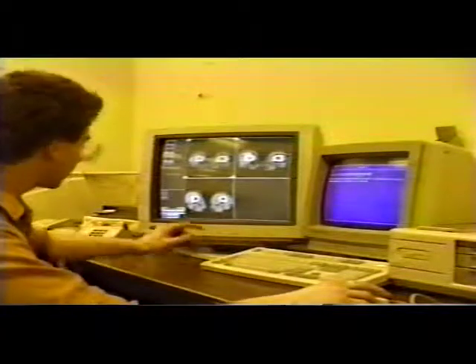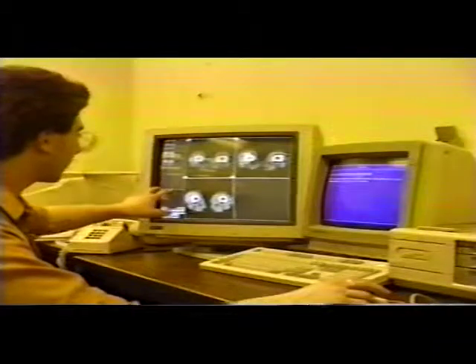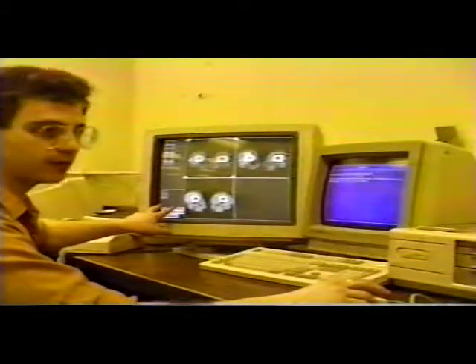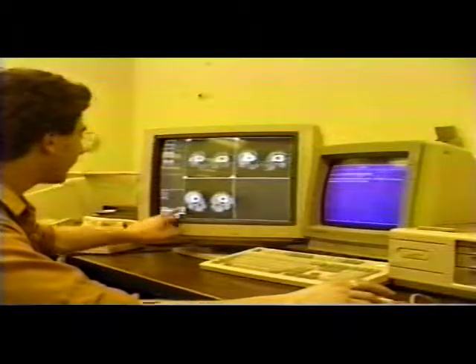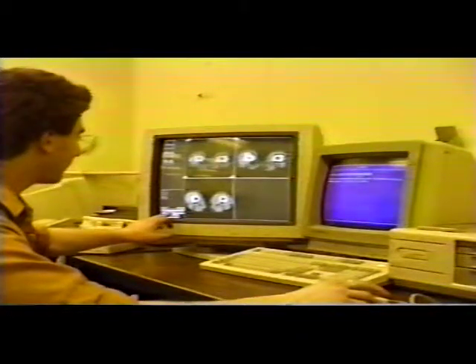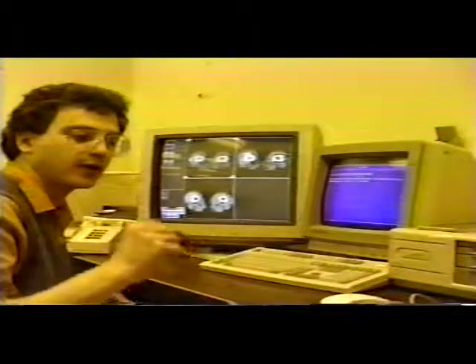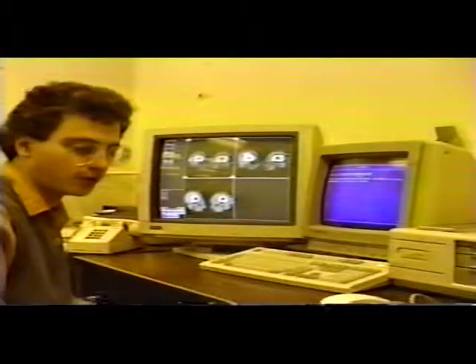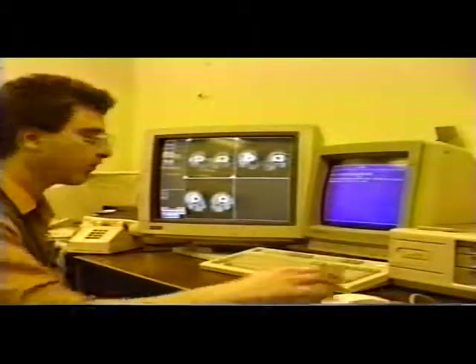Now before I do that, I should explain that this is where icons for the current study are. This is where icons for the old study, any icons that you might hold are. And this area is variable. You can change what's displaying there by clicking on one of these radio buttons, and I call them radio buttons because they work like buttons on your AM radio in the car. You click on one and you hear that station. You click on another, you hear another station.